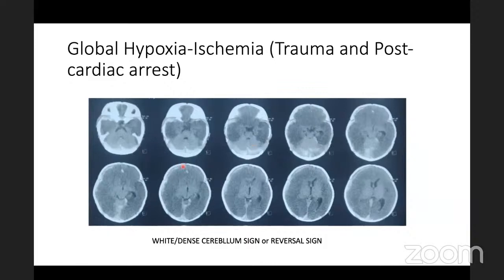And in addition to this, to prove that it is trauma, you can see that there is a subdural hemorrhage on the left frontotemporal area as well, right? So this is the reversal sign. I'll finish with a few calcifications. These are the last 3-4 slides.